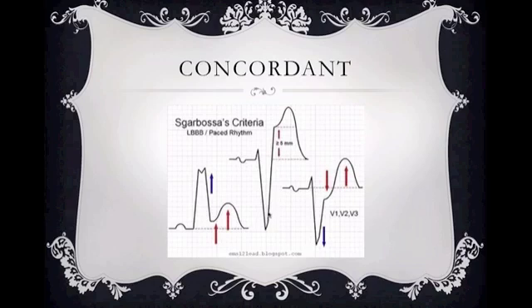Well, here we see a downward deflecting QRS complex with largely, is that a word? Largely? Well, this is largely elevated, greater than 5 millimeters. This is that too much of a good thing. We have discordance, but it's inappropriately discordant because it's greater than 5 millimeters. Remember, sensitivity of this is about 20%. So we're looking at this ST segment in relation to the size of my R wave. This is about half the size of my R wave, so that would be grossly out of proportion. We want a smaller ST segment in relation to my R wave.